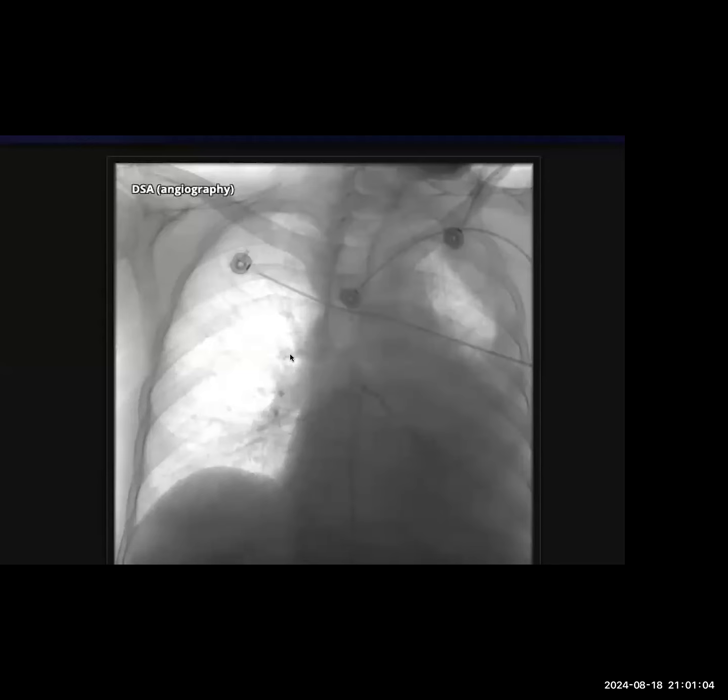I'm provided with a frontal study of a digital subtraction angiography. I'm going through the given study to assess for abnormality. This is a dynamic study.